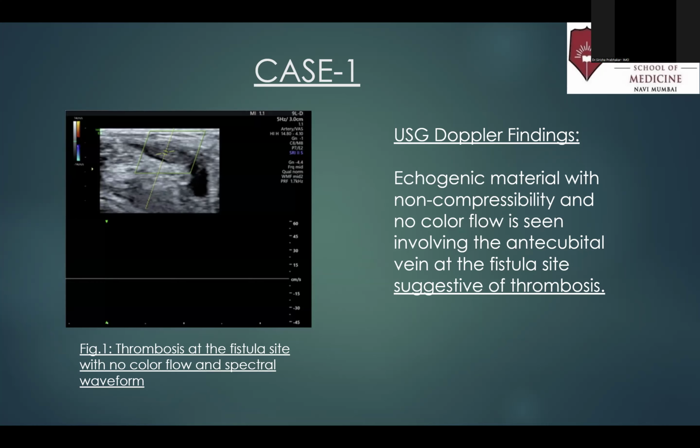The take-home message from this case was that loss of thrill is an emergency. This fistula was completely thrombosed and unusable. Without alternative access, this patient couldn't receive dialysis.